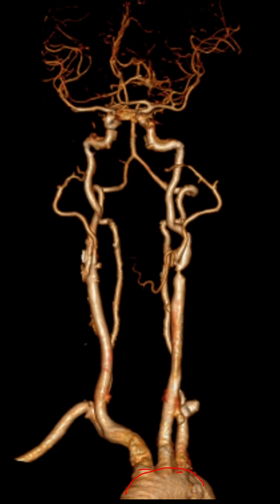As we discussed earlier, this is the right side and this is the left side. Which is this vessel, which is the first vessel arising from the arch? Right brachiocephalic trunk. This is the right brachiocephalic trunk. Brachiocephalic means it is going into the brachium, that is the upper limb, and the cephalic, that is to the brain. Which is this vessel? Right subclavian. This is the right subclavian vessel. This vessel which is arising here is the right common carotid artery. And you can see one small vessel which is coming behind. If you trace this vessel back, it is arising from somewhere here, from the right subclavian. This is the vertebral artery.